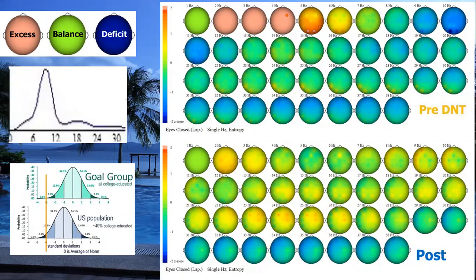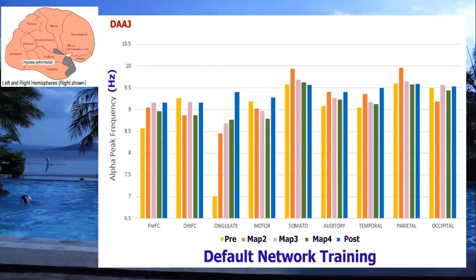Too much, excessively so. All right, this is over the various brain maps. There were some other therapies being done, especially this one for number 4, I remember that time period. But you can see general progression. We're getting more alpha. There were some changes here, but we're generally getting much more alpha than we did in the beginning, and especially in the decision-making areas, emotional regulation.